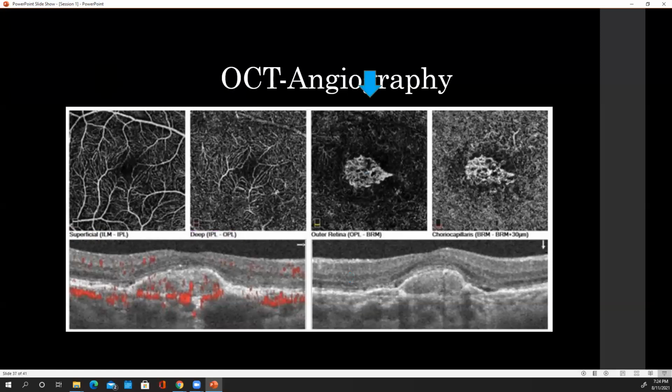Now we do the same thing over here. This is supposed to be the outer retina, which is the outer plexiform layer between that and Bruch's. That's what it's saying. But let's draw that line here, right? So you can see here, if I draw a line here, that's between outer plexiform and Bruch's, what they call Bruch's membrane, which we know is the RPE-Bruch's complex. You see it's supposed to be between here, but if you look, this guy's showing up. Why is he showing up? Because if I took a slice through it, I'm actually catching it. Do you see that, Giselle?